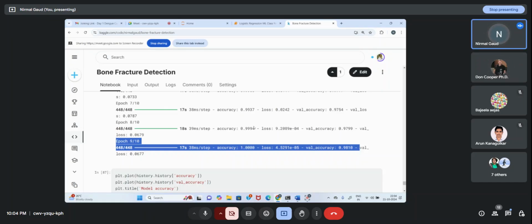Well, adding RGB is not adding any information, but the point is, I want to use pre-trained models ahead, which do perform on RGB scale, RGB color mode. You are saying that images are in grayscale, that means from 0 to 255. And if I change those colors into three, red, green, and blue, they will not add any additional information. Right. Changing the color, making a black and white image into a colorful image, it doesn't add any information.